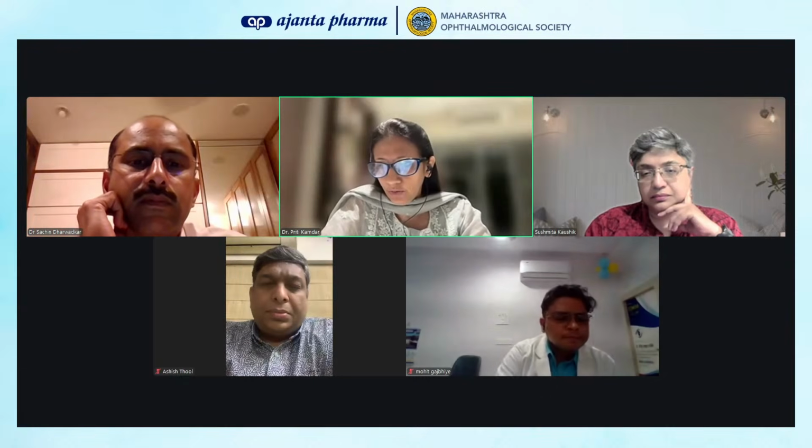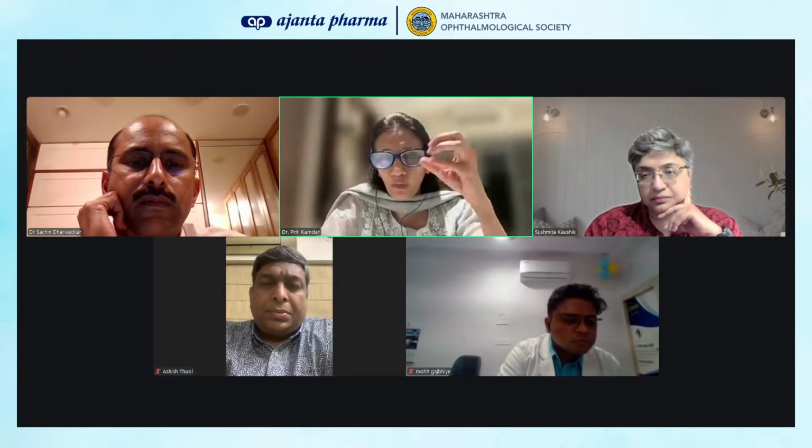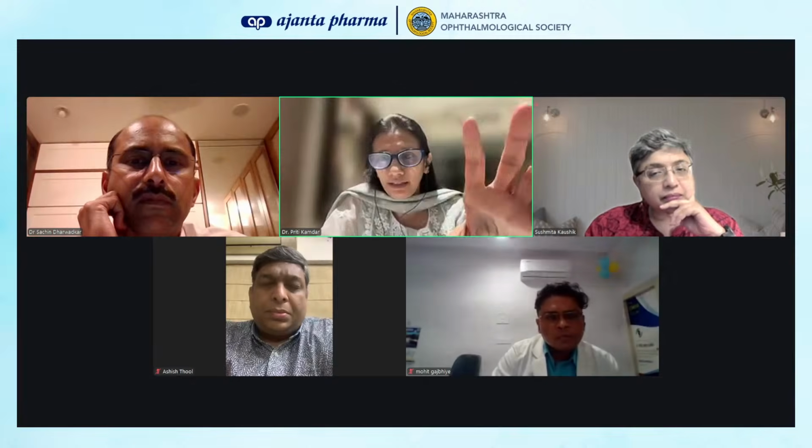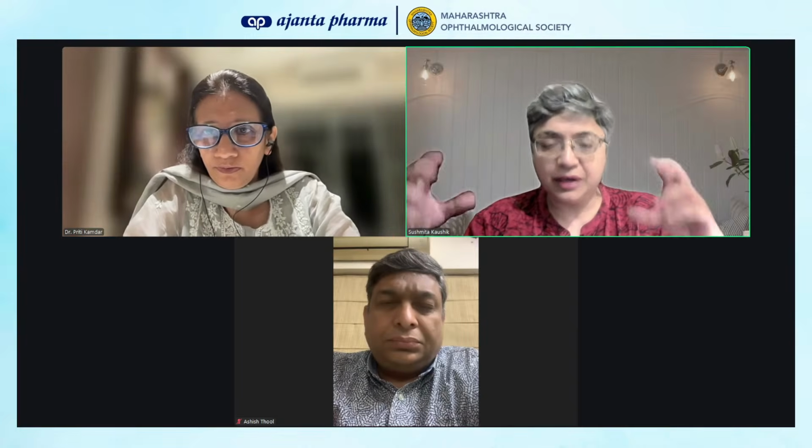So the second question was reading OCT as a pure beginner in glaucoma. So Dr. Sushmita, just quick 4 or 5 points. Pure beginner, so maybe a PG or someone like that who has the OCT printout in their hands. How can they start? First thing is the RNFL thickness map right at the beginning. The deviation would depend on what the normative database is, and let's not get into the complexities of age and thickness and disc size and all that. The first two is the thickness map and the second two is the deviation map. But look at thickness.